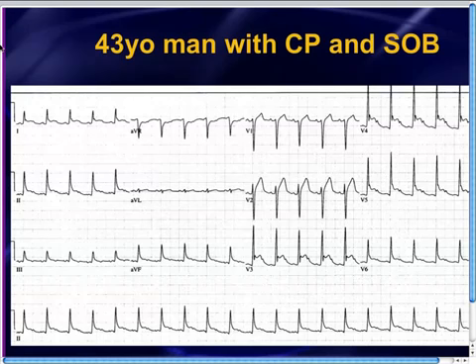And we are oftentimes trying to debate, well, we'll go through the differential of the various causes of ST segment elevation. Of course, STEMI is the one that we worry about the most, we lose sleep over as well. Let's first of all talk about the rhythm before we get into ST segment elevation. And this kind of is a little bit of an extension of what we talked about last week.